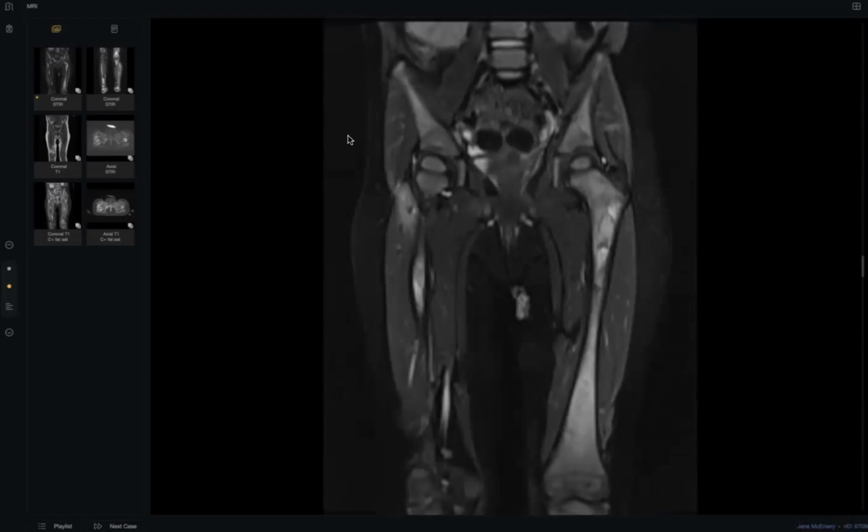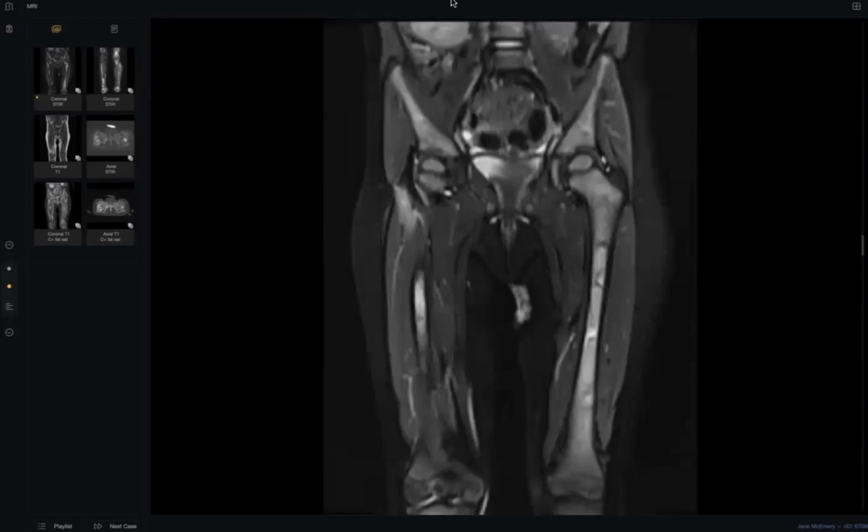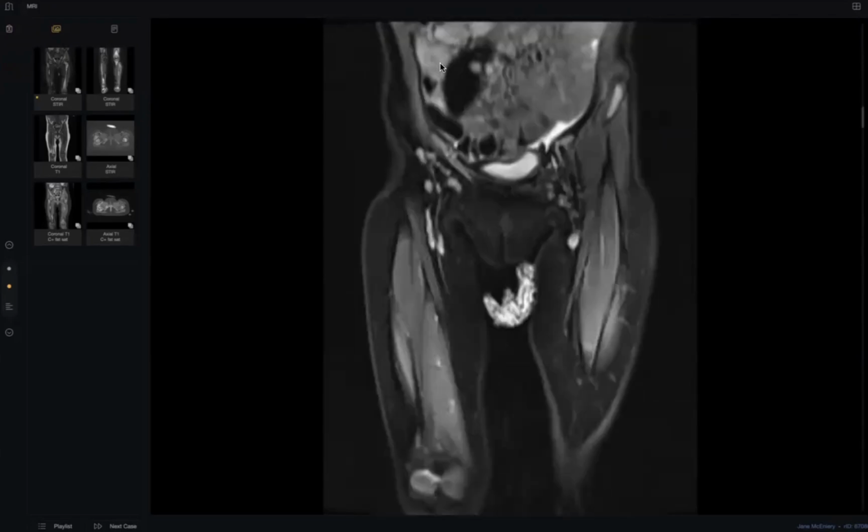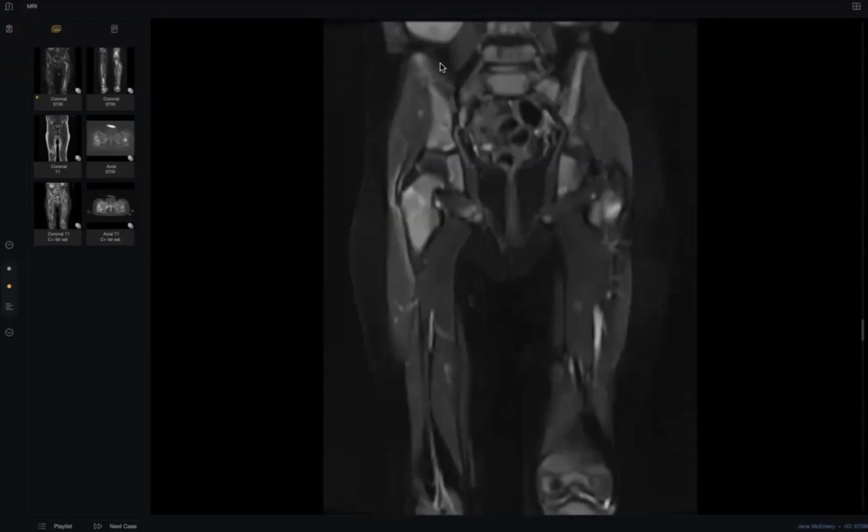So give me a differential. Sir, now the top differential is metastatic deposit, likely from a renal primary. Look at the age, sir. The age is 3 years. And bone metastasis. What is the most likely? Neuroblastoma. Excellent. Despite it not being clear whether this is the kidney or the suprarenal, from the age and from the type of the metastasis, you can expect it. Thank you, Dr. Umer.